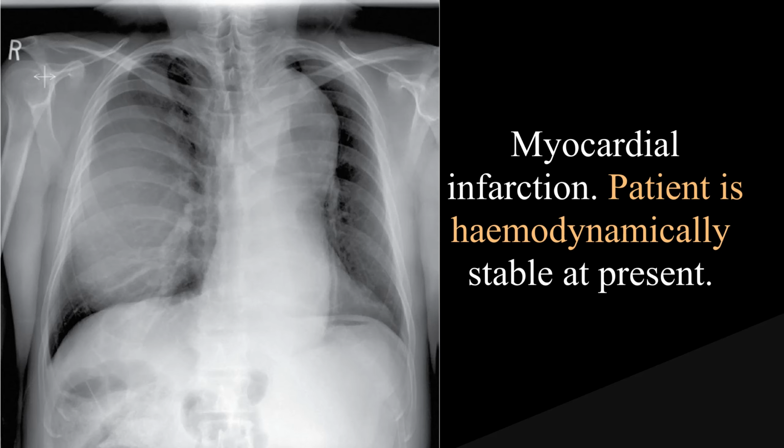There is gross enlargement of the thoracic aorta. Large oval opacification extending from the right midzone to the base without obscuration of the vessels. Left lung is clear. Findings are consistent with either a leaking aortic aneurysm or a leaking thoracic aortic dissection.